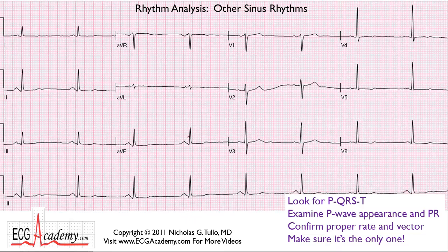And this one looks a little bit like the first ECG. And if you'd rather look at the heart rate first, that's completely up to you. The first thing you should look at is regularity. Look at the forest, and these beats seem to be fairly equally spaced. And the heart rate is slow.